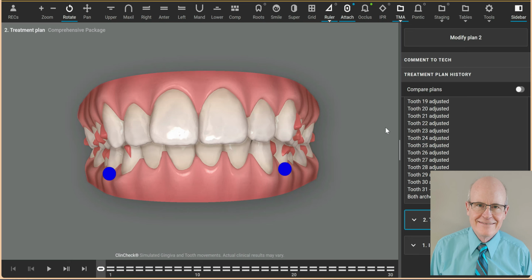Do you use the 3D controls to develop dental arches for your Invisalign cases, or do you usually accept what is sent to you by the technician? Most arches developed by Align look good from a visual perspective, but there may be unnecessary or hidden movements that can dramatically affect the outcome and extend treatment time.